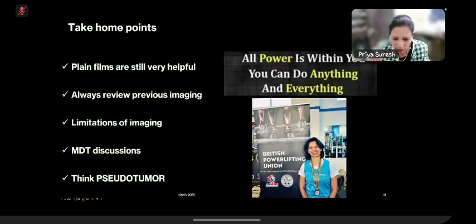Yeah, that is more than enough to say it is loosening. Okay, you don't need loads of other tests, because you cannot have the prosthesis moving. It shouldn't just move. I mean, it will subside a little bit, but if you have quite significant subsidence, then that is a clue enough. And again, that is because you have plain films and previous imaging that you can compare it with.